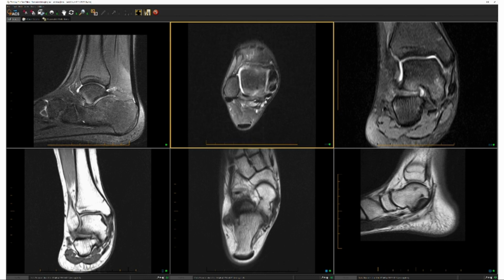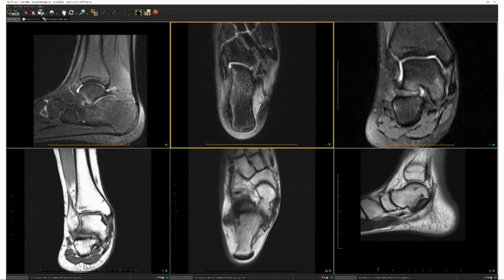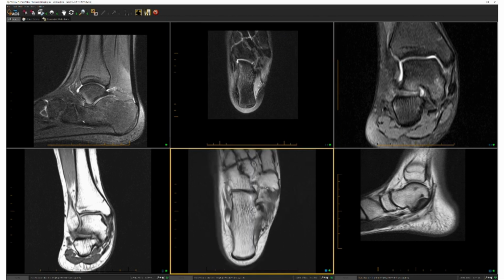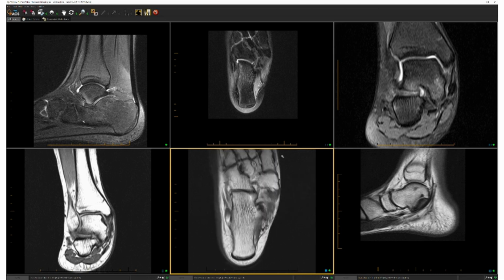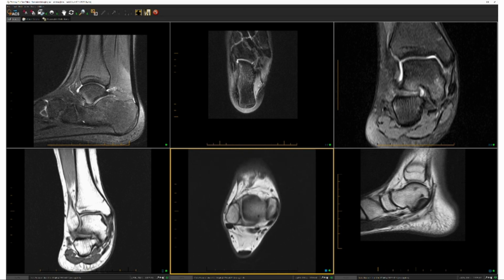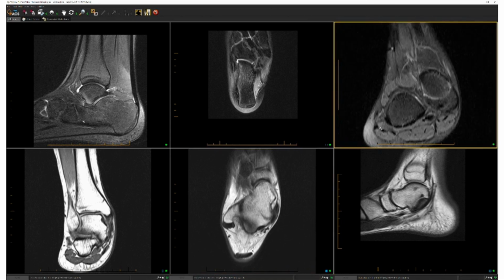So let's take a look at the biomechanics of this case and take a look at the talar head and how that talar head is slightly uncovered or medially rotated with respect to the navicular. Now, we can't completely see the hallux here, but we can see the base here. And notice the vector of the talus is far medial to that. So we can suspect that this patient has overpronation biomechanics.